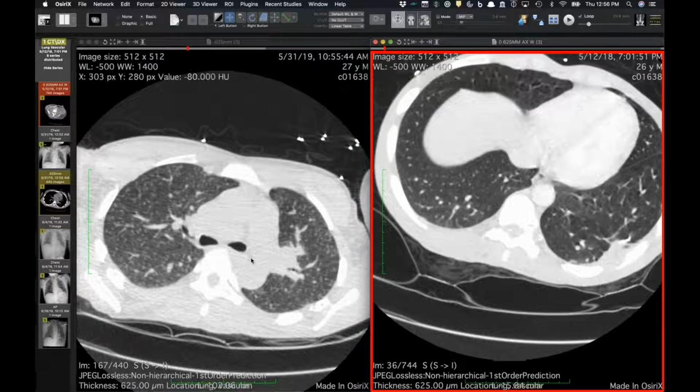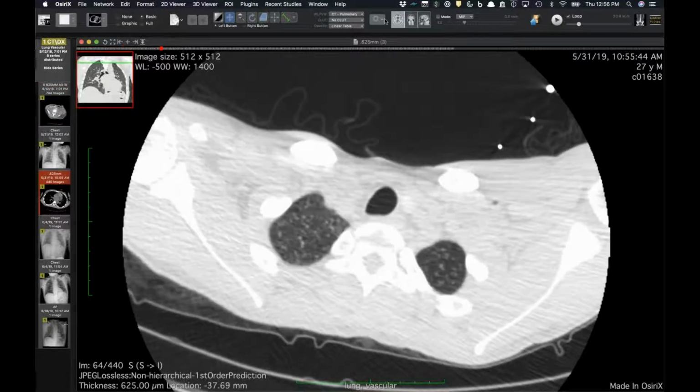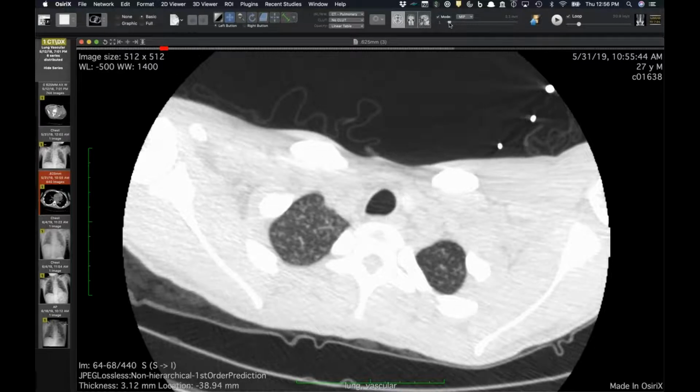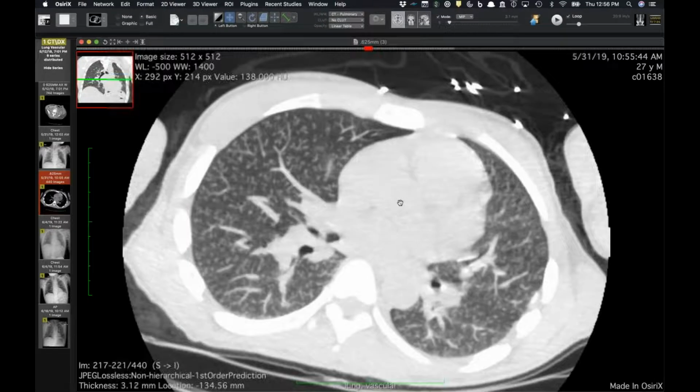Wow. And you make like a 5 millimeter MIP, I would say, something like that. Yeah, well, we can do that. Oh, very nice.